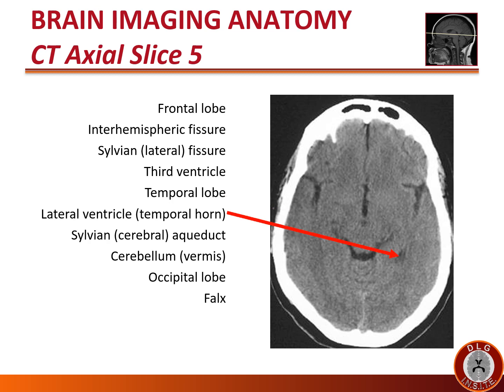At this level, the temporal horn is seen more dorsally as it runs back to join the body of the lateral ventricle. Note that because this CT scan was obtained slightly asymmetrically, we only see the temporal horn on one side, but it is common for the temporal horns to be very small in a normal person without cerebral atrophy.